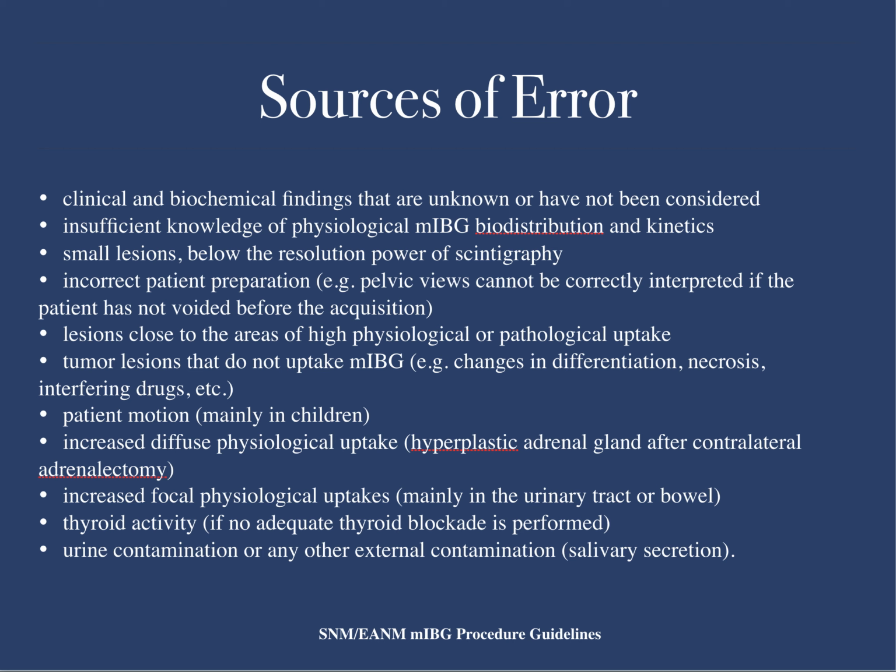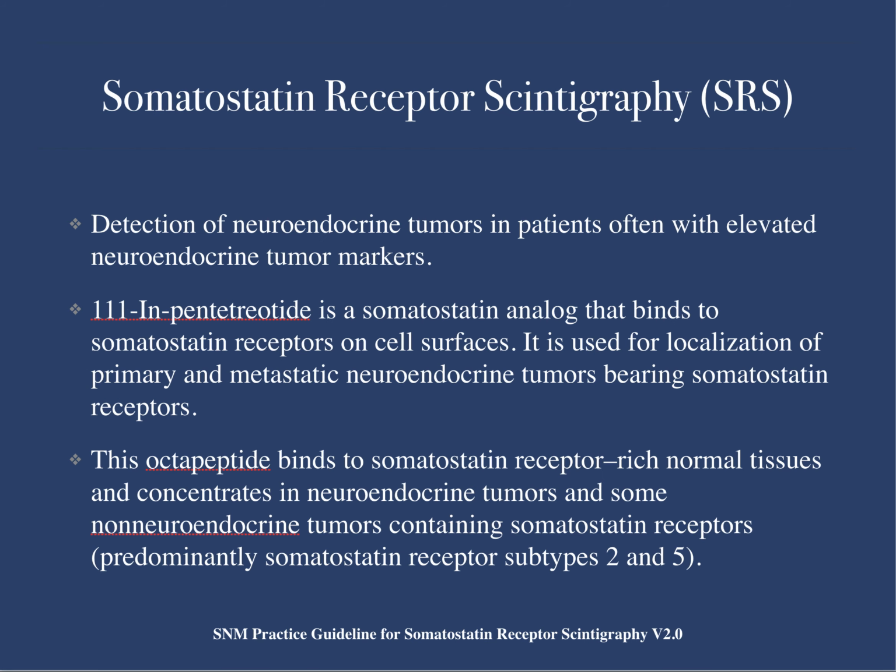There's a variety of sources of error that can occur in MIBG scans. However, in my experience, this is usually not an issue unless the tumor just refuses to take up MIBG, and that certainly happens. Tumor can do whatever tumor wants, which is why cancer imaging is fun or interesting. But if the tumor does take it up, the diagnosis becomes very, very clear.